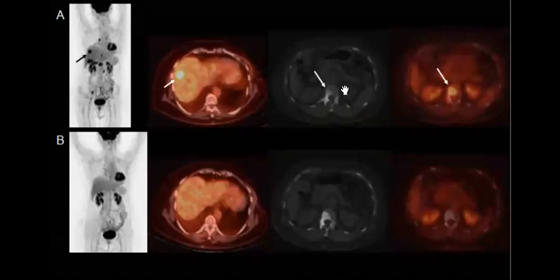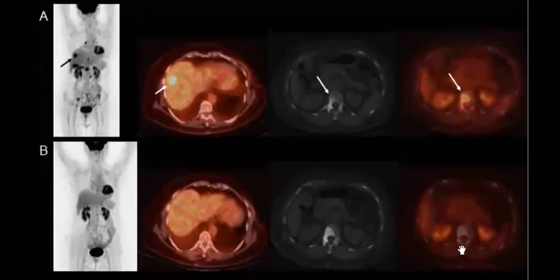And here the lesion had high uptake, but the sclerosis was less. And when the healing or the response happened, you can see the sclerosis becomes more, right? But when you look at the metabolic activity of this lesion, it is finished, or you can say it is much decreased. So this means that this patient is healing.